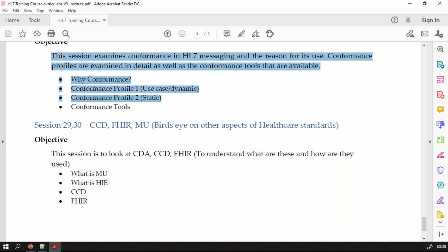There is not much change with respect to how we build. I have 3.8 on my system, but both of them are pretty much the same. So we'll be going through any one of the versions. You can install 3.9 and work on it using the same principles. The principles and the basic concepts remain the same.